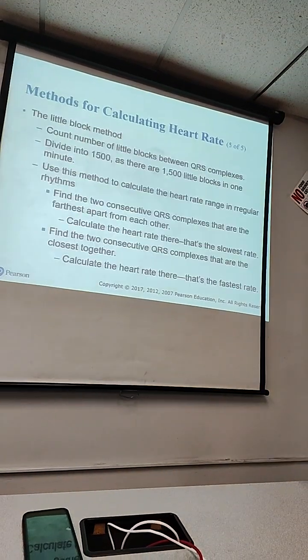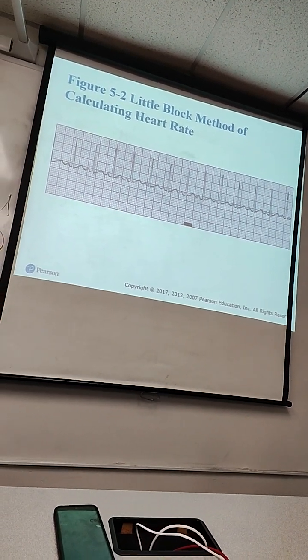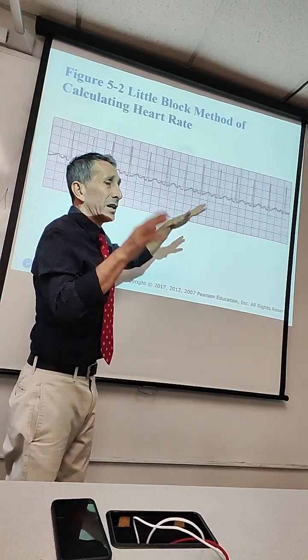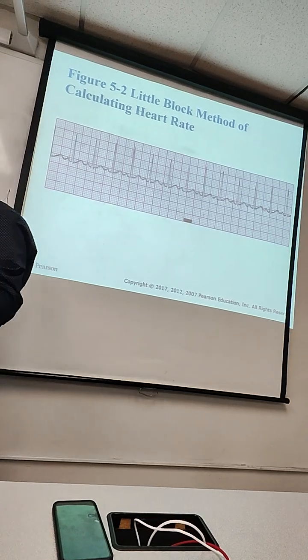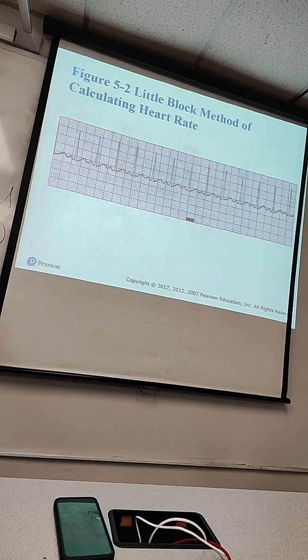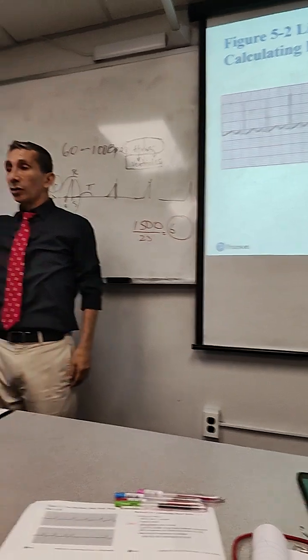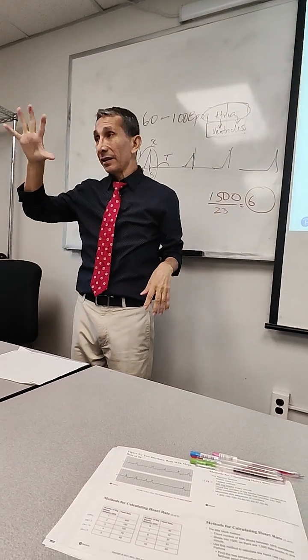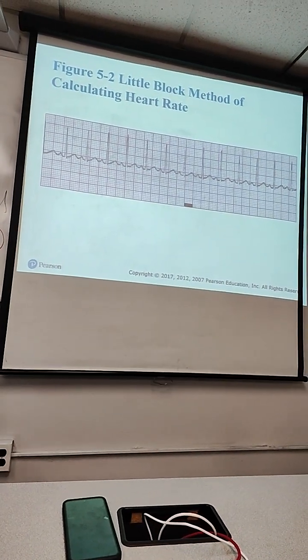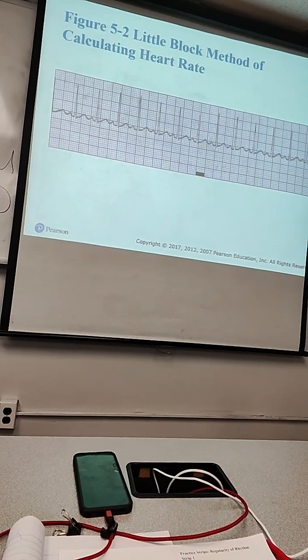The other ones, you will see that they are very nice, like every little distance in between the QRSs or the Rs is the same distance, the same pace, because that's how the heart is supposed to be. It's the same pace. It closes, opens and closes, opens and closes. But if it beats and stays too long for the next beat, and then beats very fast, and then it stops, your heart is not functioning properly. So that's what's going on right here.